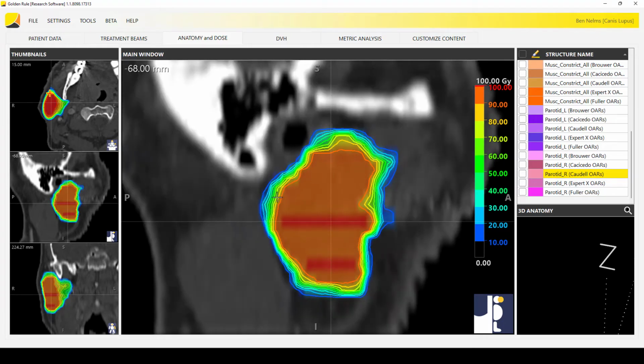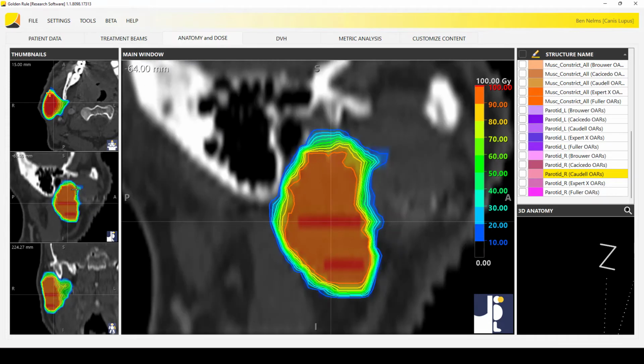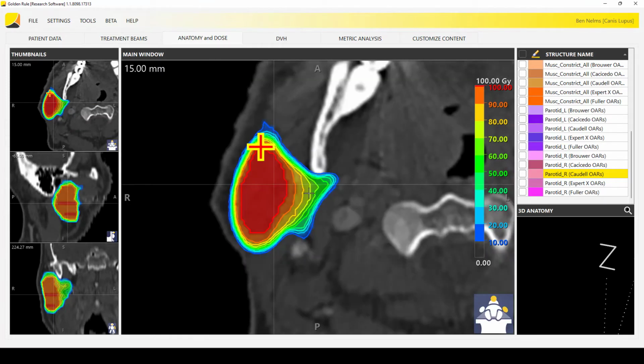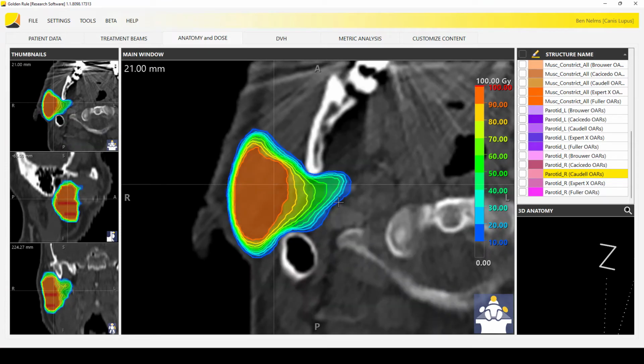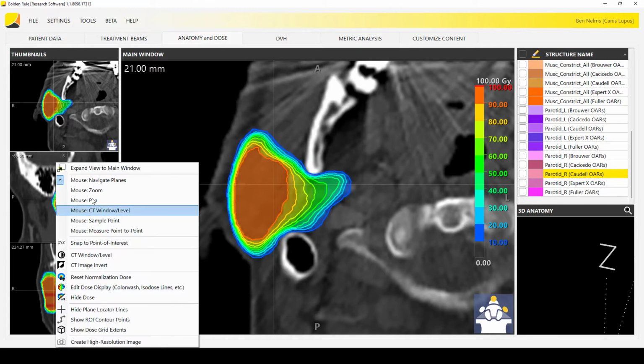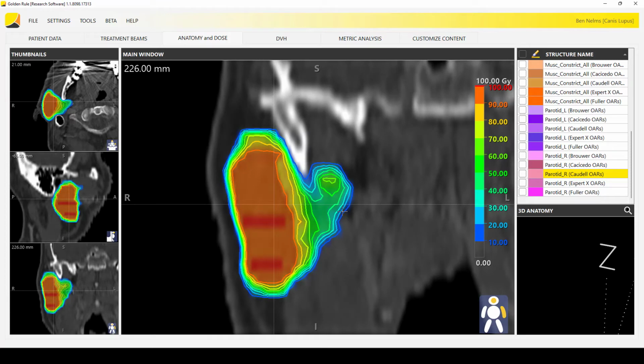This is very interesting. These gradients are following pretty well in this view, except we do start to see differences as we move inward. So there's a big region of disagreement where my mouse is. Very high agreement, obviously, here at the edge and in this belly of it, but a lot of disagreement. This big spread out region indicates a disagreement. And if I look at the coronal view, you can see it from a different view. So when you see it balloon out like that, that's where we need to figure out what's right and what's wrong.